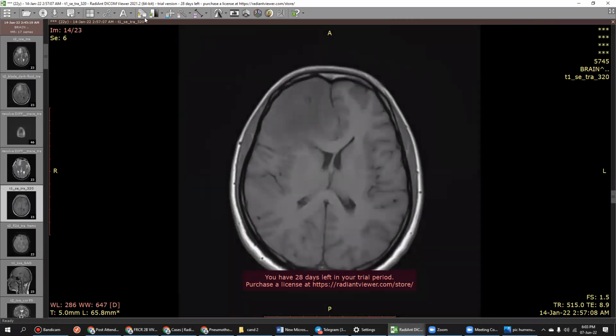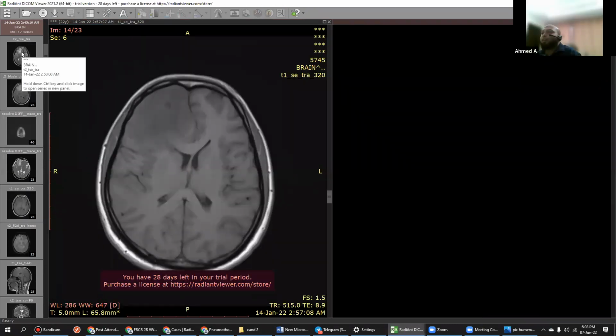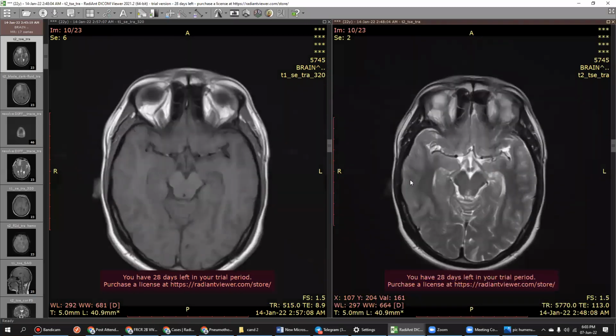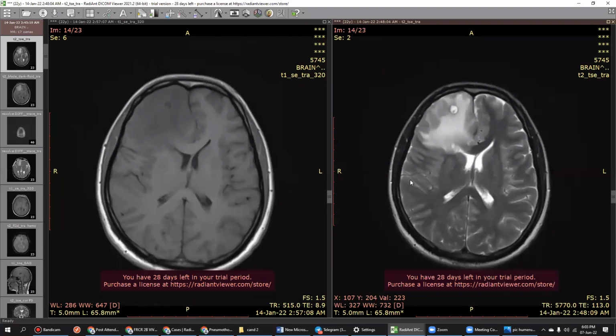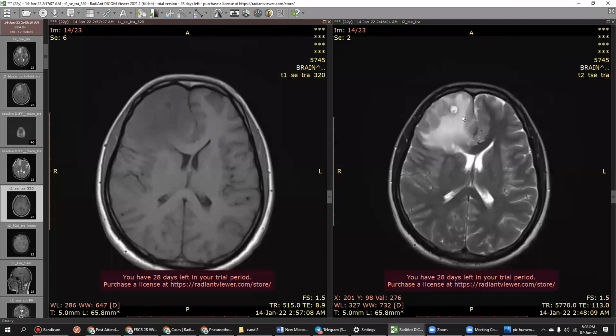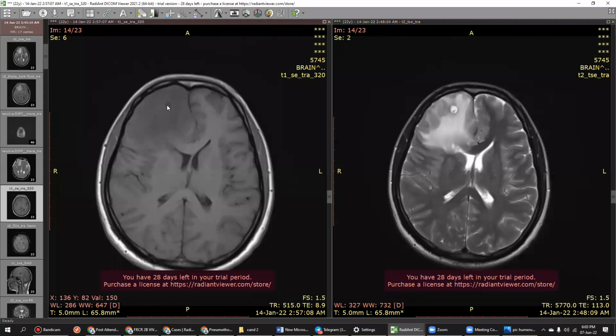This is TB, low signal intensity foci. Why are you saying TB? It's so classic a case. You are from India only, no, Ruby? Classic. You are from India? Pakistan. Same region. What is this? This is a colloidal vesicular stage, this is the NCC, neurocysticercosis. Can you see this? Okay.